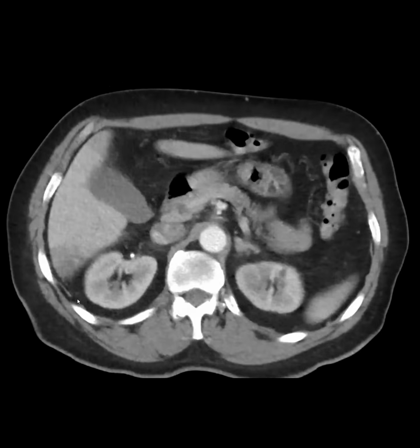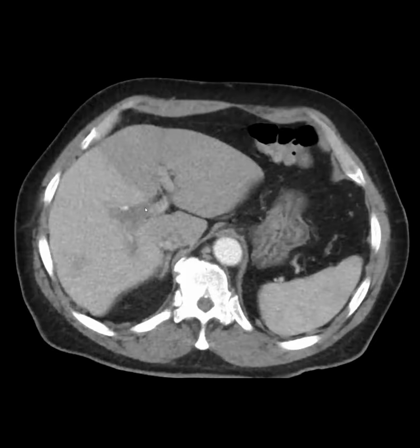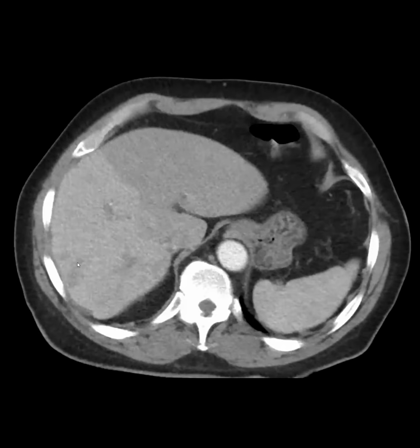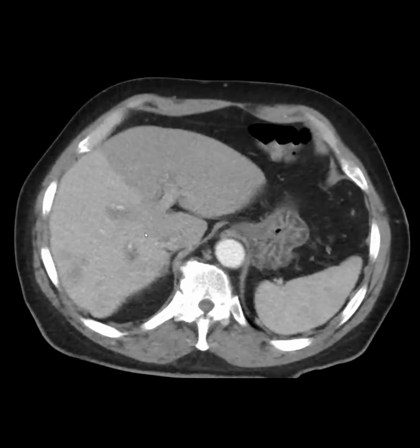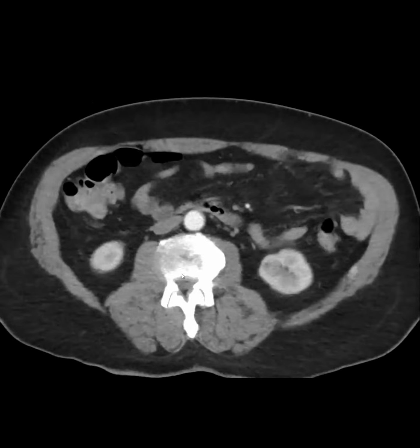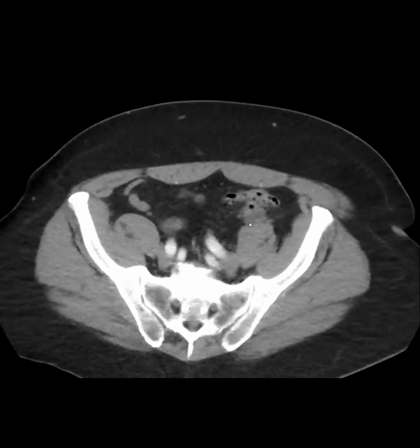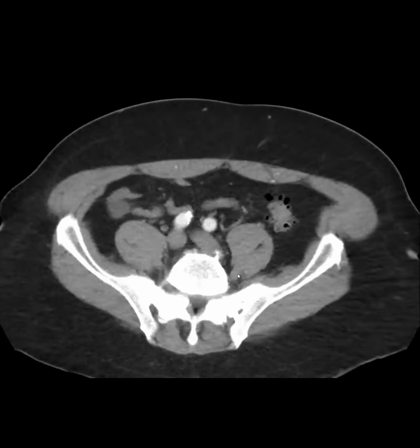So whenever you have a thrombus, you think, could it be tumor thrombus or bland thrombus? And on a CT, you can't really tell. I'm going to show you an MRI where it looks like a bland thrombus and these look like micro abscesses. If you think there's liver abscess or septic pyelephlebitis, which is infected thrombus of the portal vein, you go look for a GI source. So appendicitis, diverticulitis, etc. 50% of the time we never find the source because it already resolved. But in this particular situation, we have a little perforated diverticulitis here.